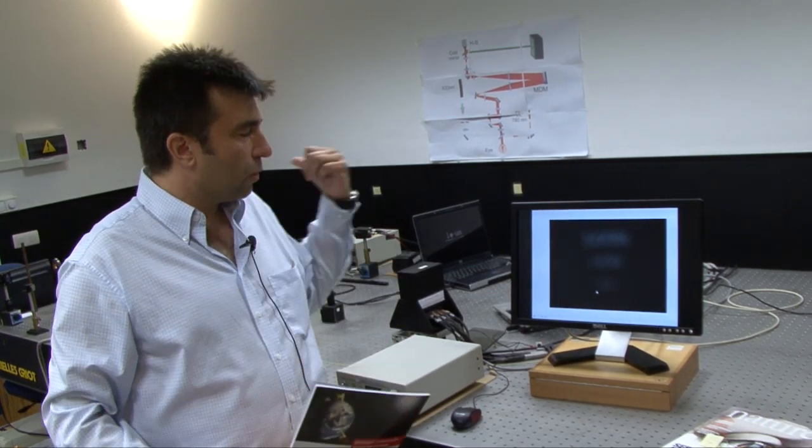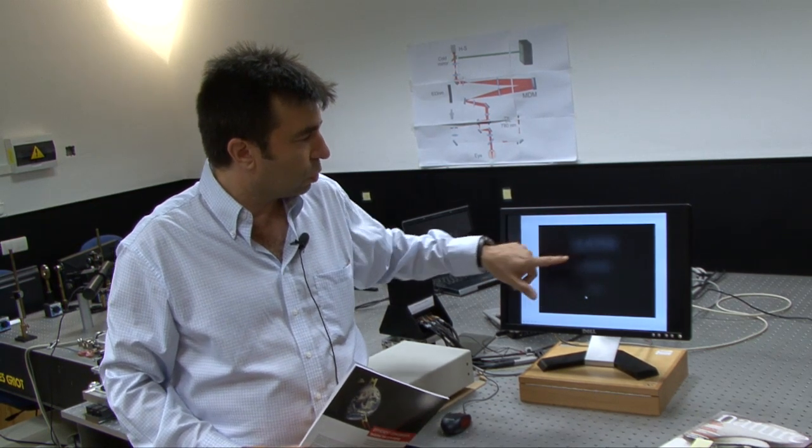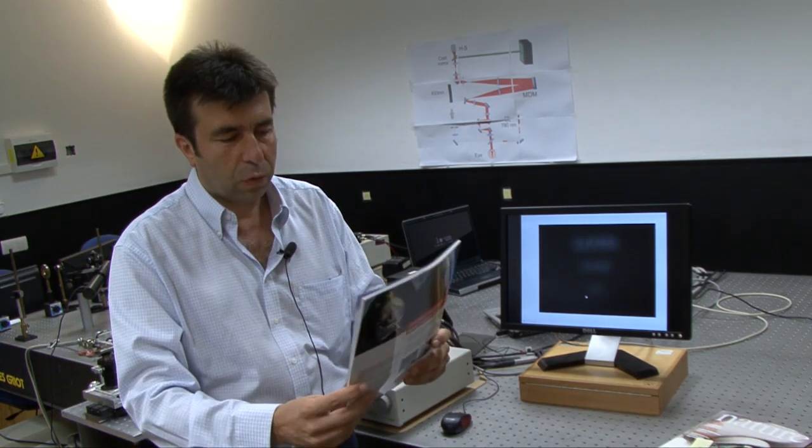I can tell you that we are using this instrument really to try to obtain solutions to correct for presbyopia. So people who cannot really accommodate, who cannot read near, can do it more properly.